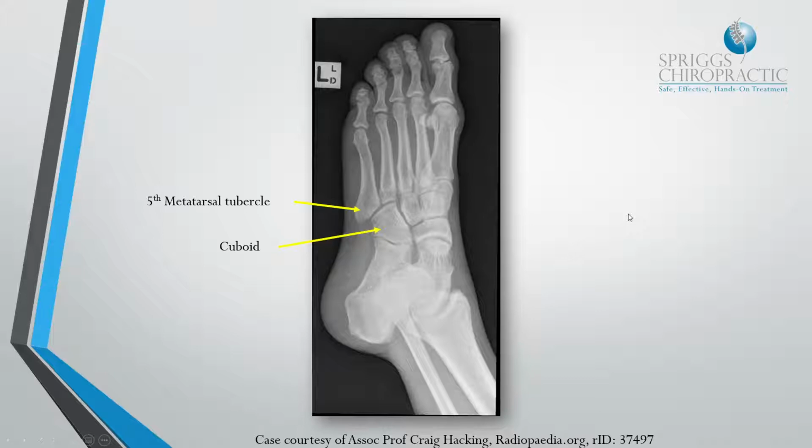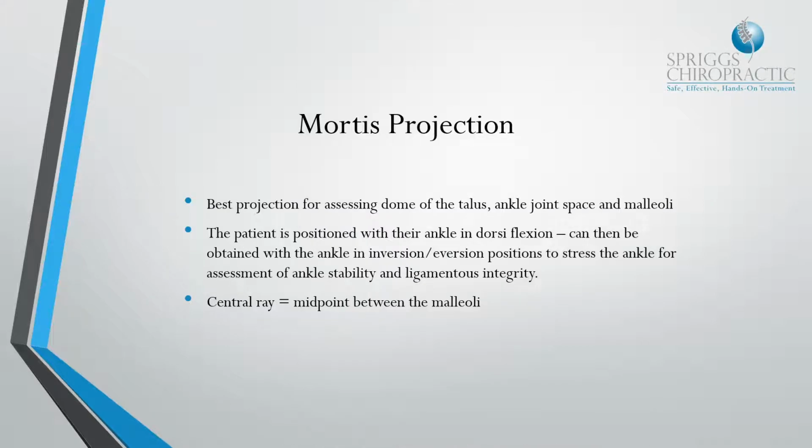And there we are, just to prove that I do know my anatomy. And there's your labels that I completely forget about, which is why I'm shocked when they turn up on the screen. So the Mortise projection, sorry, I'm just enjoying a bit of coffee.